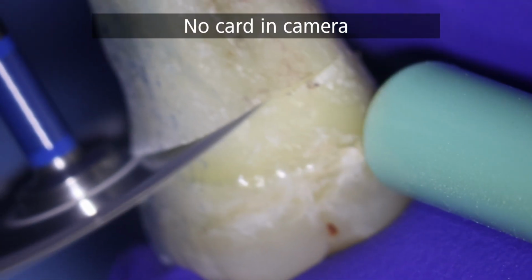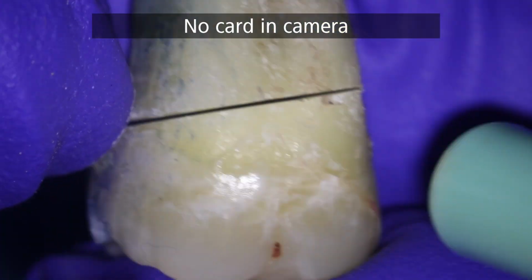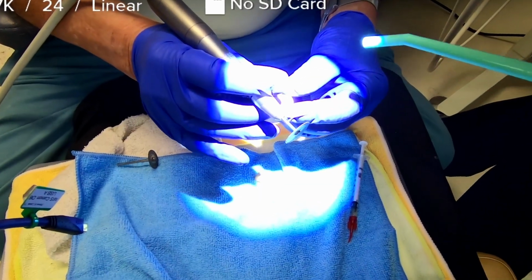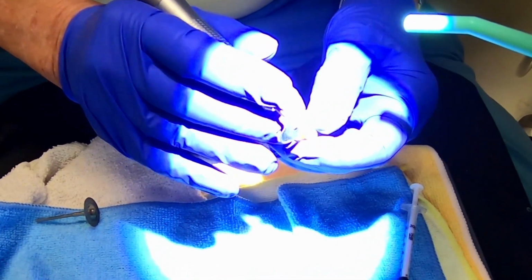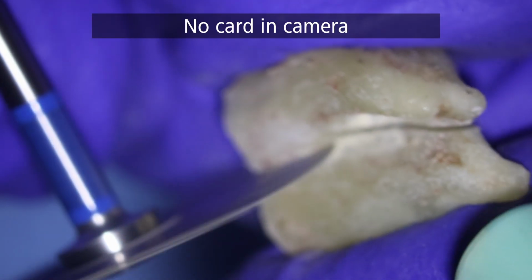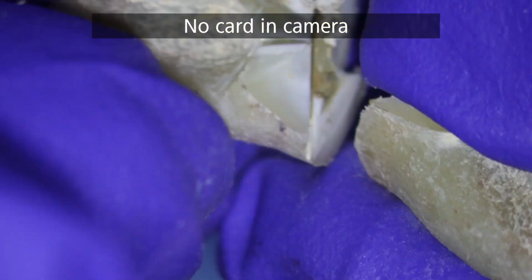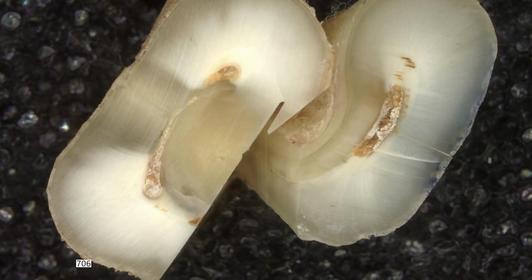That's the section of the coronal half of the tooth, and that's the GoPro view. And then we sectioned vertically to separate the mesial root from the distal. Dr. Carwan had me take pictures of the sectioned root, and now we're going to attempt to split this sagittally. It was difficult to do because of the curvature of the root and the deep invagination of the root on the mesial.